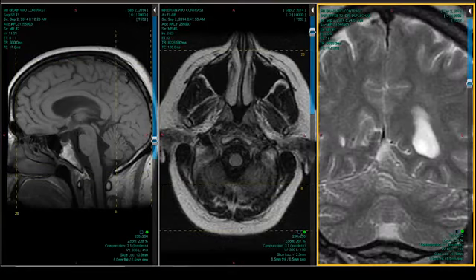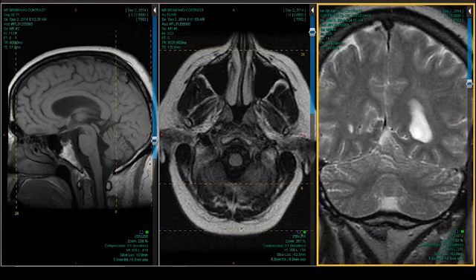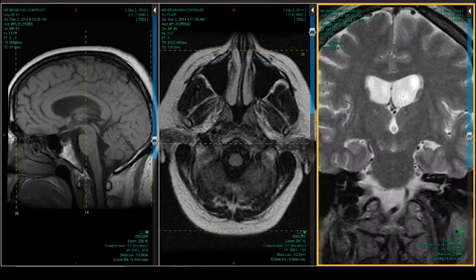And let's check out the coronal. I think we've got a coronal T2 here. Maybe have it a little too big. Let's go right to the choroidal fissure. It's a little wide. How old is the patient? 56. A little wide. Temporal horn's a little big. Entorhinal cortex looks great. So not going to be Alzheimer's disease, I don't think.